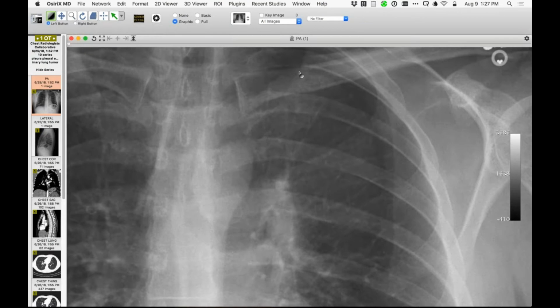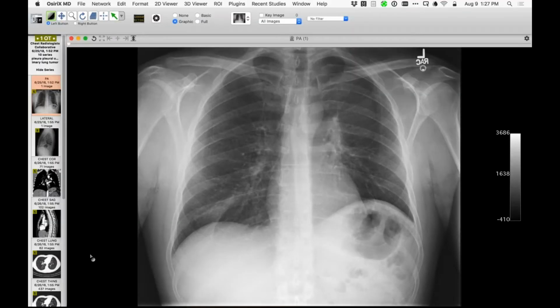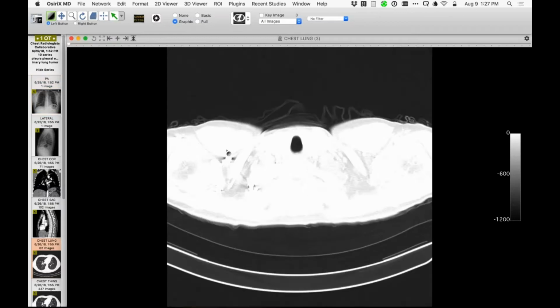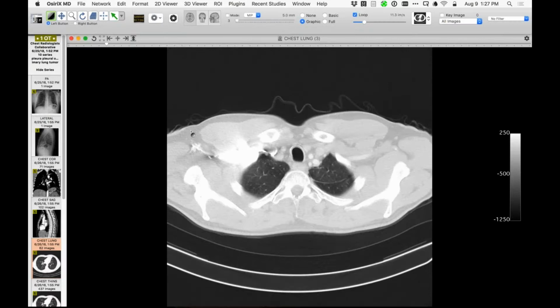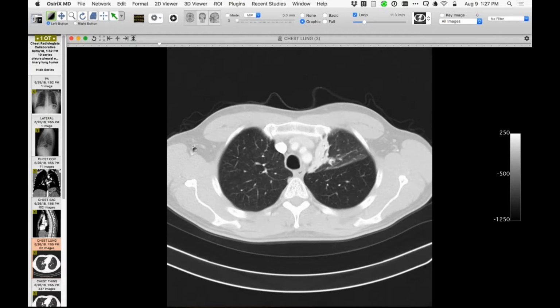Again, here is the interface that one can perceive, and it's kind of subtle. Now I'm going to show you the CT that goes along with this. And thanks to Leif for showing me this case, because it turns out to be rather interesting.